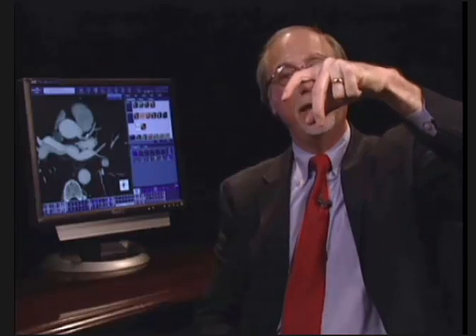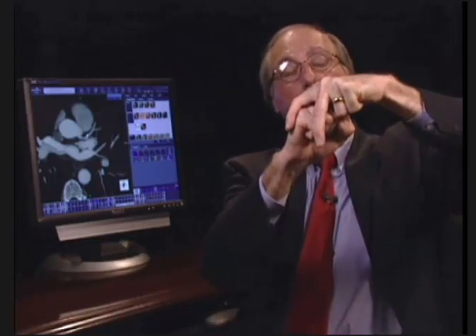This is the coronary anatomy, where this is the left anterior descending, this is the circumflex artery, and this is the right coronary artery. The diagonal vessels come off in this direction, the marginal vessels off the circumflex come in this direction. So I'm going to be navigating the coronary arteries on a globe, basically on the heart. This allows me to manipulate and allows me to have an intelligent and very efficient way to look at the coronary arteries.